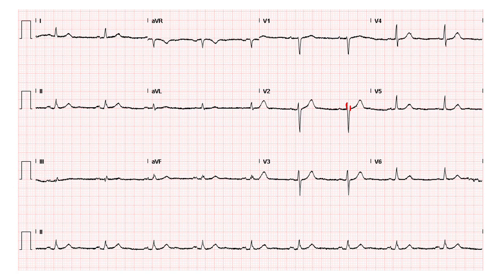And so I'm going to take a look at the rhythm strip at the bottom because there are clearly definable P waves throughout the entire rhythm strip. So this is in lead 2. Remember, if I'm looking for sinus nodal activity, is it regular? So here's my P wave. I'm going to come down here, P wave, P wave, P wave. And you can count those out or march those out throughout the remainder of the EKG. So I do have discrete P waves, and their rhythm does appear to be regular.